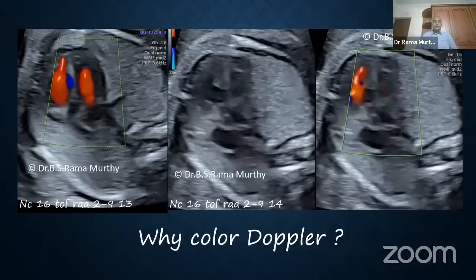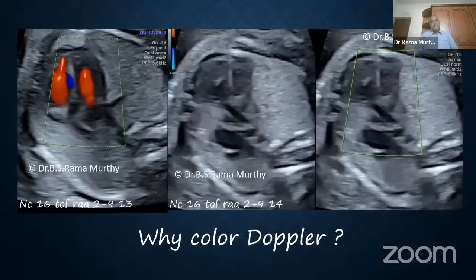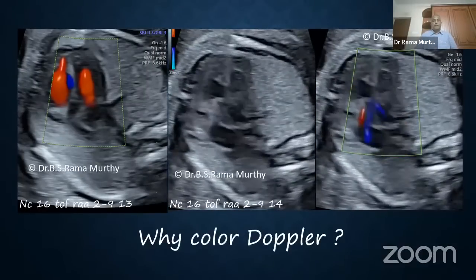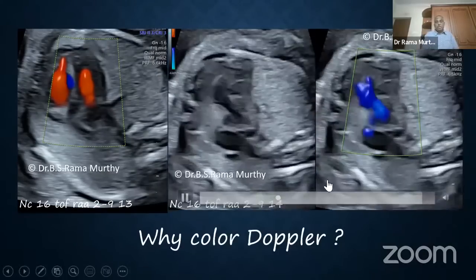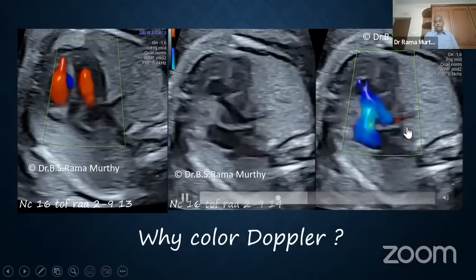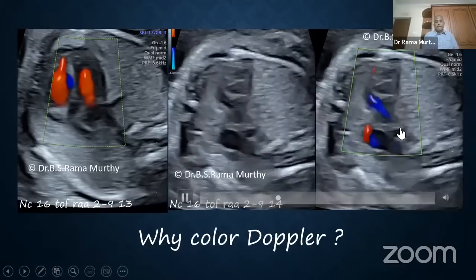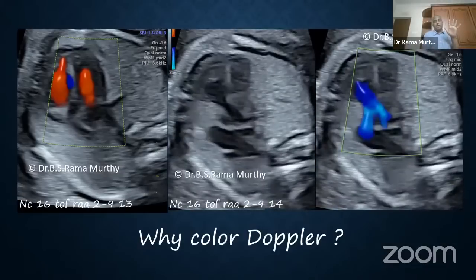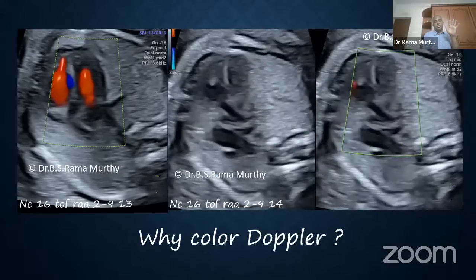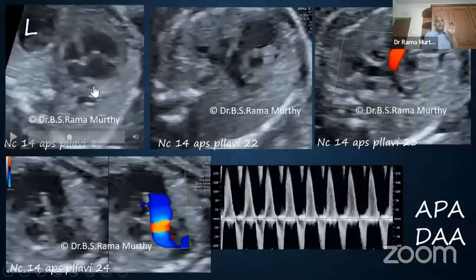So your total diagnosis is tetralogy of Fallot with a right aortic arch and with a ductus arteriosus agenesis. And also color helps you to earmark the aorta going to the right of the trachea here. So it's a right aortic arch. So that is how you answer those 5 questions. You have got your final diagnosis. Now from there, we move on to another case scenario.